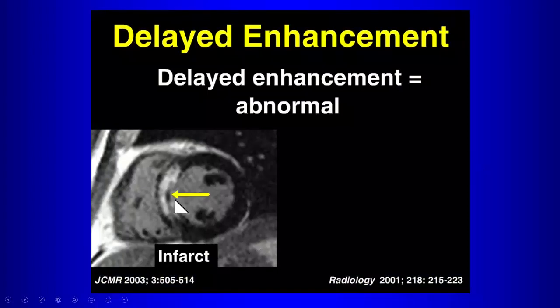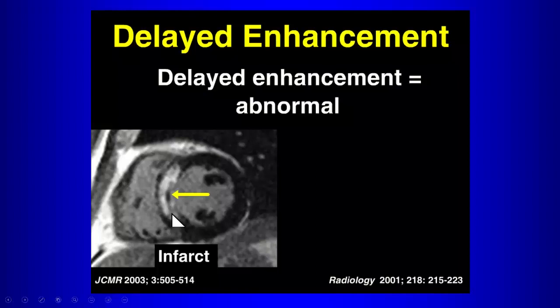So with infarction, it should involve the endocardial surface. It should be in a vascular distribution. So what distribution is this infarct in? LAD, right? Now that area of dark signal is also an indication of something, right in the middle of an infarct. What is that an indication of? Thrombus. Not thrombus, no. That's in the myocardium, that's not the endocardium. Anybody? St. Barnabas, you guys know?